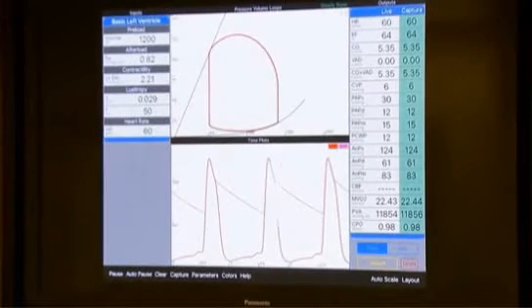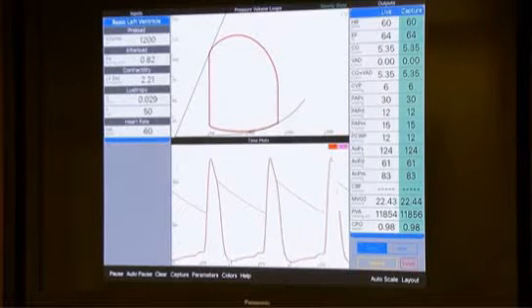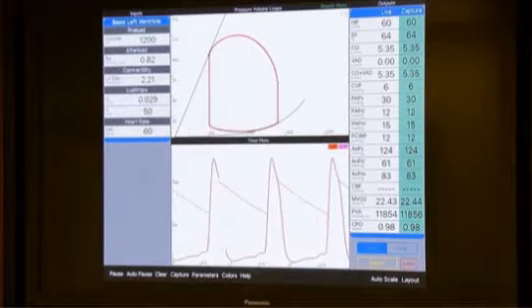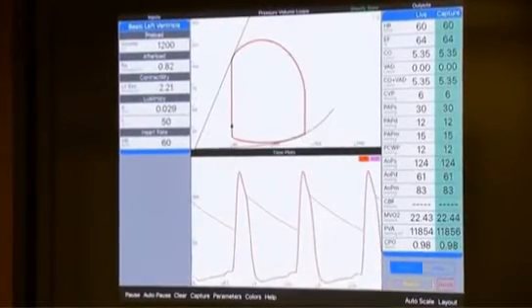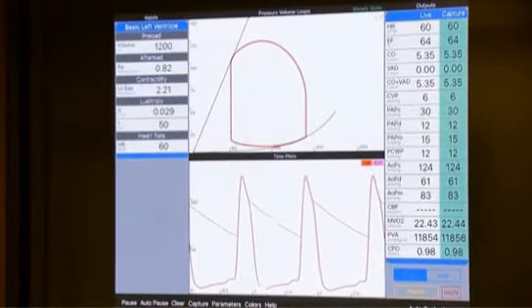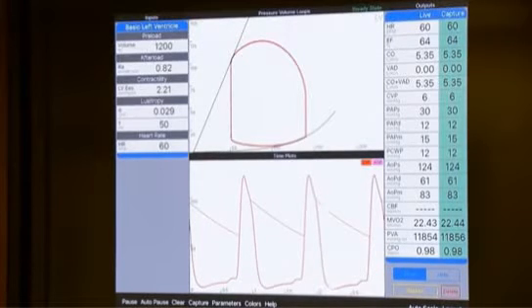And there are two columns there. In the green are numbers that I have stored. So they're locked and they're not going to change. Next to it are the live numbers. So if I make a change on the inputs to the simulation, the live numbers will change and we'll be able to compare them to where we started in the green.